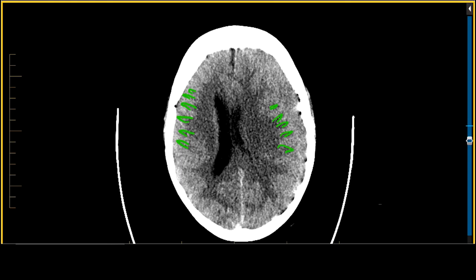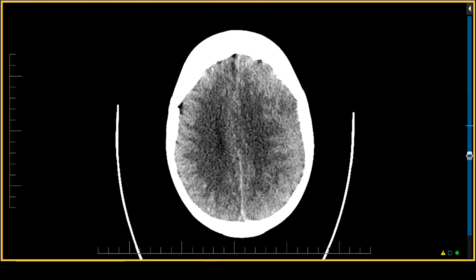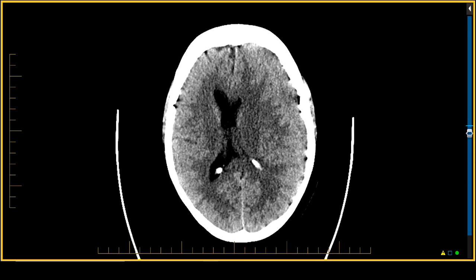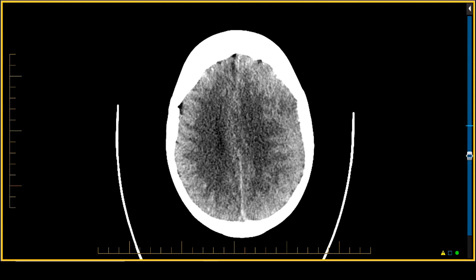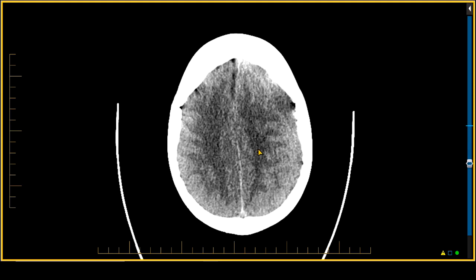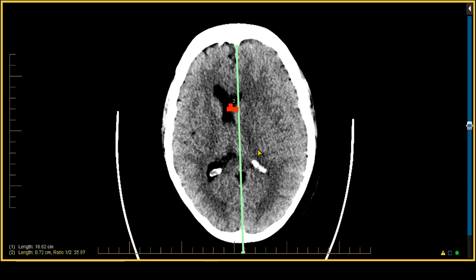And you can see that actually the cortical margin on the left side is located where I've drawn my arrow and my line. Although you do not see a hyperdense collection in this individual, by virtue of the displacement inward of the juxtacortical white matter, the degree of mass effect, and in some cases, the effacement of the sulci, this patient has an isodense subdural hematoma.